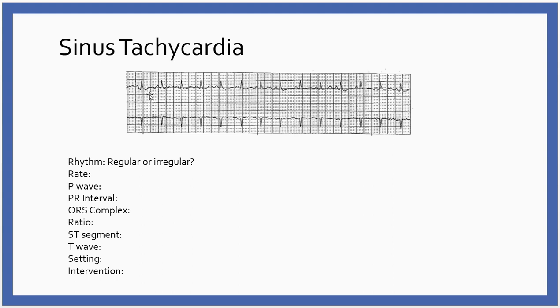Next thing I'm going to do is look at all my QRS complexes, and I'm happy they're there, and they all look about the same. I don't see a big change in morphology. They look about the same.